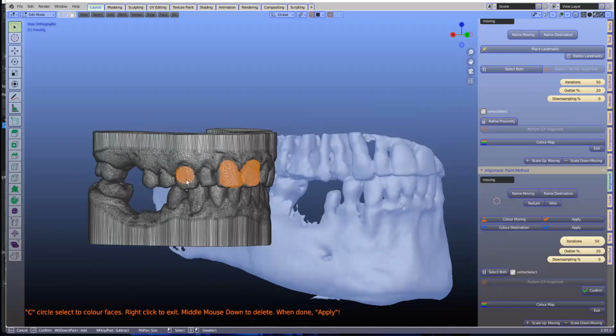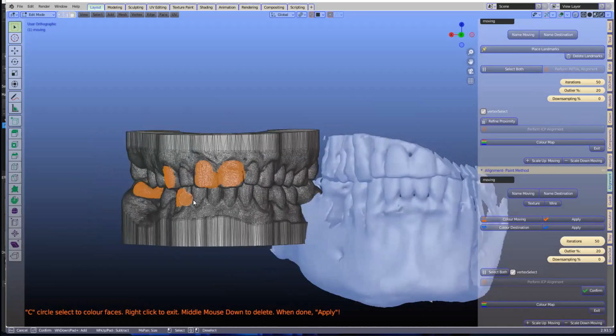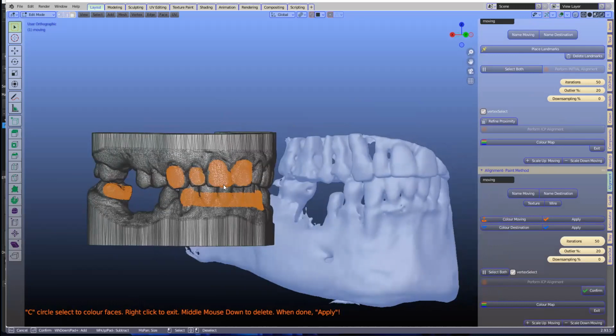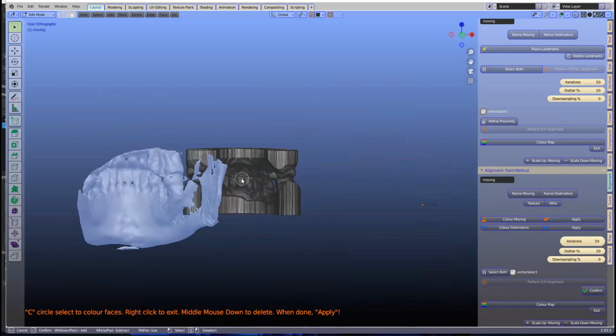When I first practiced this afternoon, I didn't have a problem with it, but that's good because then I can show you both methods. So here we're going to take this. In fact, we could select most of this over here like that. Something like that. Yeah, that's good. And maybe the inside as well, a little bit like that.